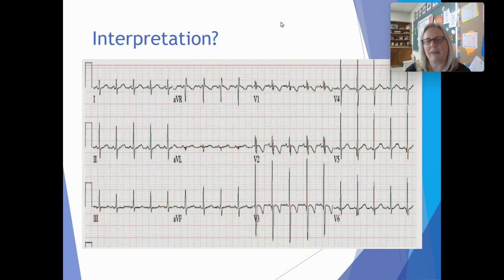But what gives us away that this is probably not an old person is the size and shape of the QRSs. They are skinny, and very tall. So that typically means that this is a small child. And then we can take a look at the heart rate and see if the heart rate matches that. Let's see. 300, 150, 100, about 100. So yeah, this is definitely an EKG of a smaller person. And in that case, this LVH we're seeing, large QRSs and inverted Ts, is completely normal.